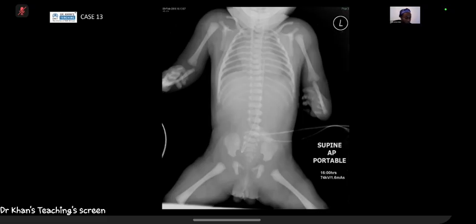So once you've made the diagnosis of esophageal atresia / tracheoesophageal fistula, there are other things that you're assessing for to make another diagnosis. What other things do you think you may be assessing the radiograph for? I think it's a syndrome. I think it's VACTERL. Okay. So what things can you assess as part of VACTERL on this radiograph?